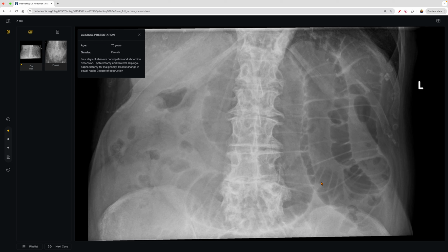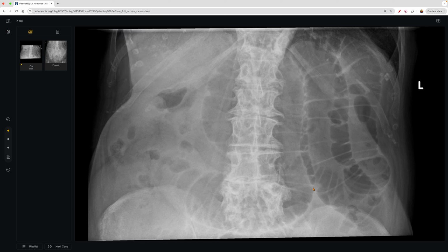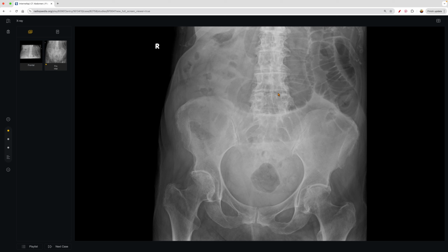In this case, the one thing you want to notice is that abdominal radiographs are rather non-specific. They don't really give you the most detailed information. But when it comes to air in the bowels, or otherwise air in general, it can be helpful. Here you can appreciate the width of the intestines, and the fact they look like giant worms or snakes or anything else you want to call it is a clue into the disease. And so that would certainly warrant a CT image.